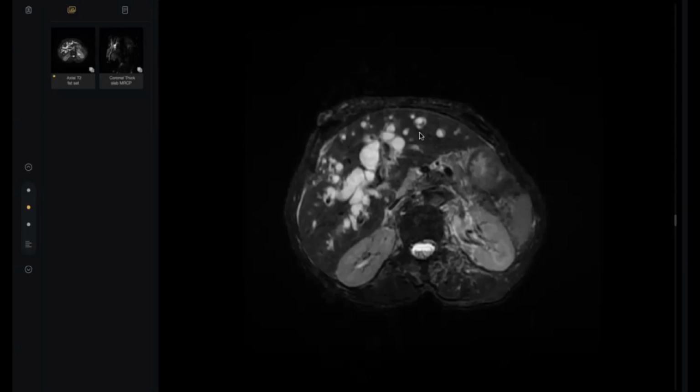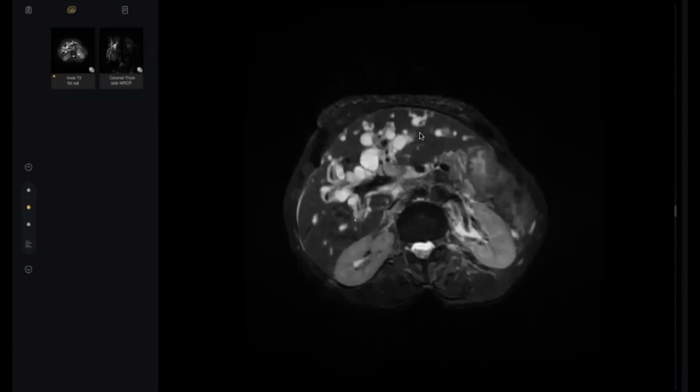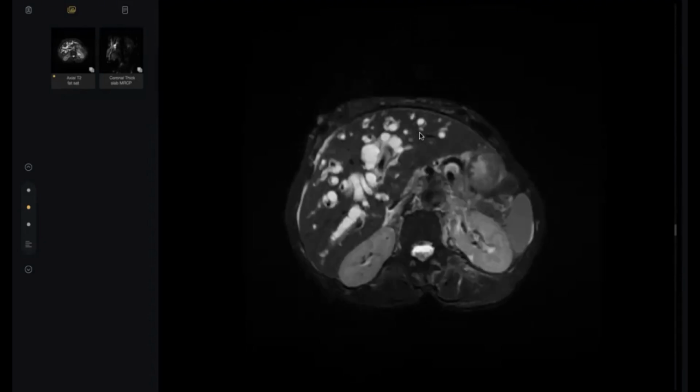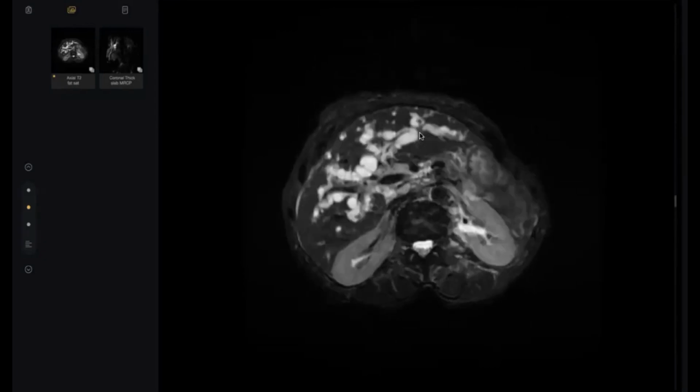obstructive jaundice, and then an ERCP guided stent can also be placed via this common hepatic duct to the distal CBD, which will further drain it. And then ultrasound guided or CT guided biopsy can also be performed. Even the interventional radiologist can perform the percutaneous transhepatic biopsy. Okay, thank you so much, doctor.